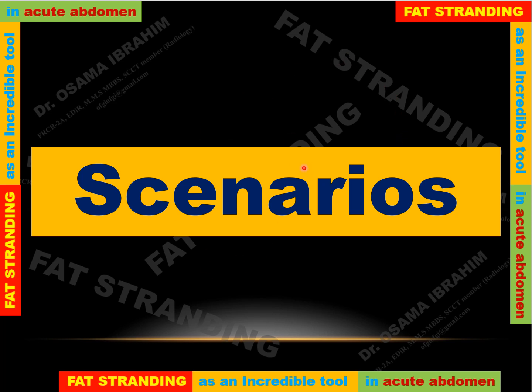And now we're going to talk about some scenarios through real cases, daily cases, to confirm the concept that fat stranding, according to its localization, can detect the pathology and the acute abdominal cause. This is very important during on-call and ER situations.